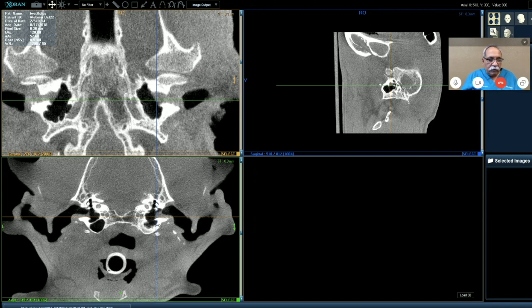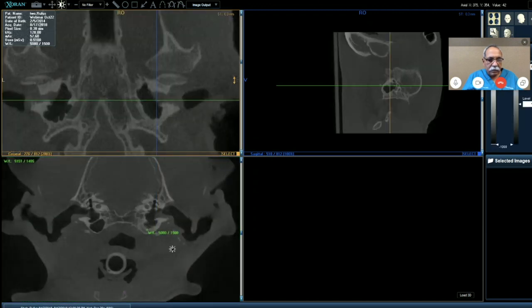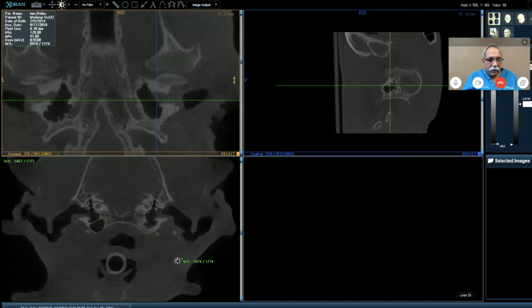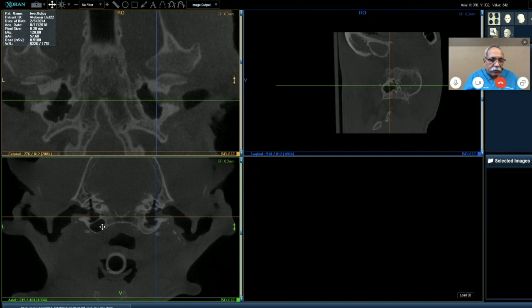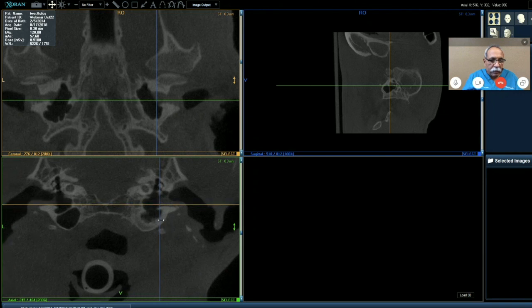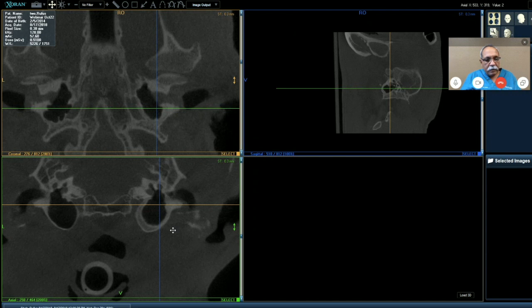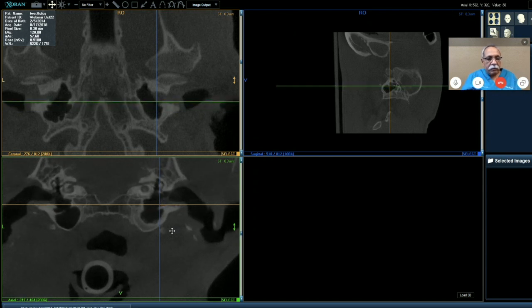And David, can you change that setting and see if that makes it clearer? Yeah, we can change the contrast. Perfect. If you scroll out, you can still see the mucosal layer. If you scroll up and down, there you go. You can see how it is lined up on the bulla surface. Very significant. This dog had a foxtail that penetrated through the tympanum into the middle ear, and this is all the outcome. Years and years down the road, this is what is happening.